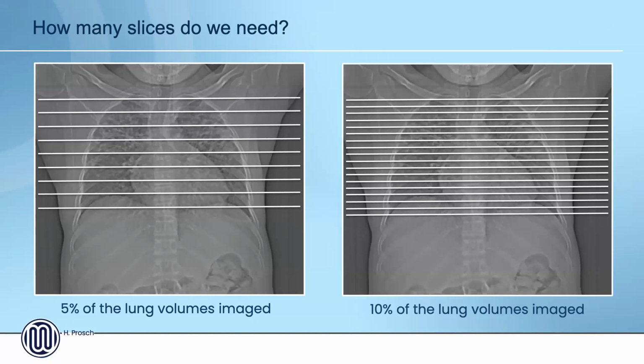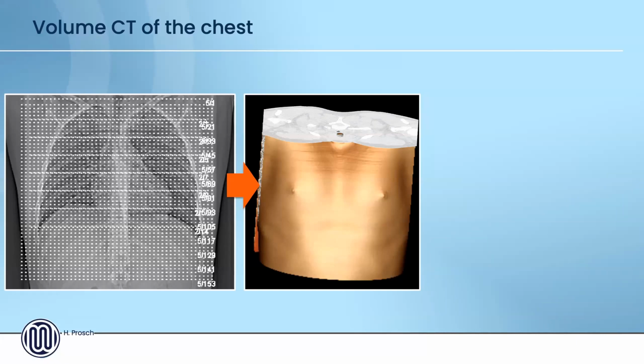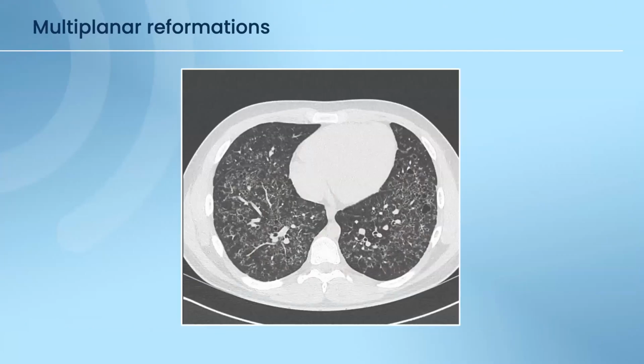Still, if you are ordering HRCT, this might be what you get back. But the better option nowadays is to perform a volume CT. Volume CTs are just normal CTs we are doing right now, which can be done in every CT scanner which is available. We are scanning the whole body or just the whole lung in 1mm thick slices. This gives us the possibility to get the whole volume information and reconstruct images in any plane we would like to see. This is helpful because, in particular in the diffuse parenchymal lung diseases, the distribution and the relation of findings towards other structures is important to delineate.